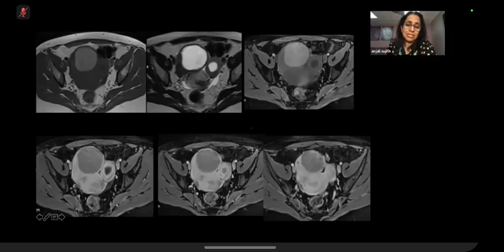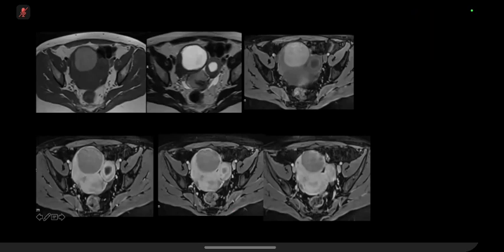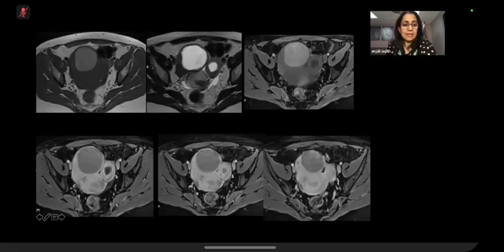Yep, candidate number 2. Okay, so we have selected MR images of the pelvis. The top left is an axial T1, T2, and then I think we have dynamic sequences post-contrast. Yeah, the dynamic post-contrast sequences are at the bottom, and this is a fat-saturated T1 axial.